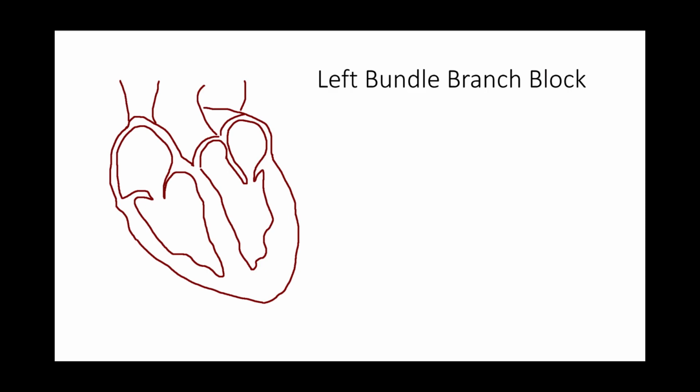Okay, now it's the left bundle branch block. One thing I want to emphasize is that there are unique criteria that must be met in order to determine if an EKG has a left or a right bundle branch block. For the sake of keeping things simple, I'm just going to refer to general rules that'll help you identify these left and right bundle branch blocks. But keep in mind that there are specific criteria out there in order to define these much more clearly.